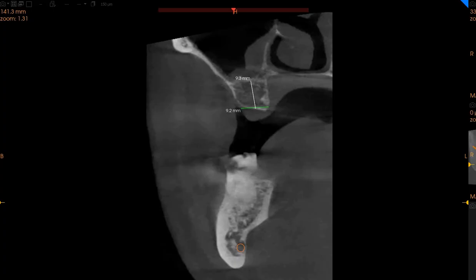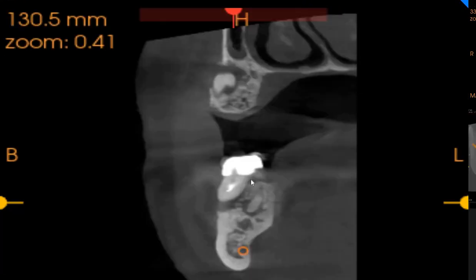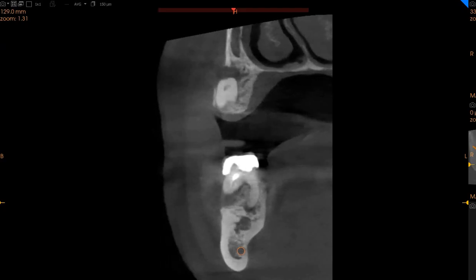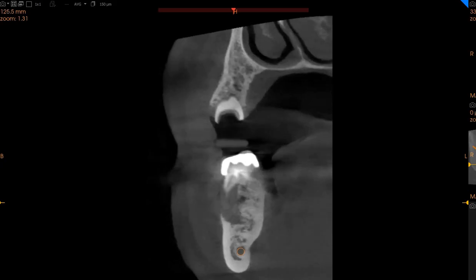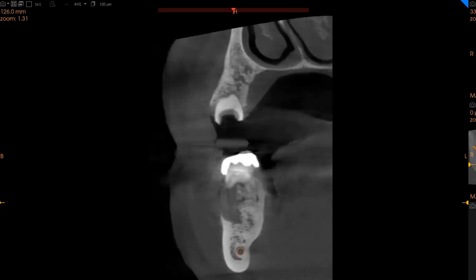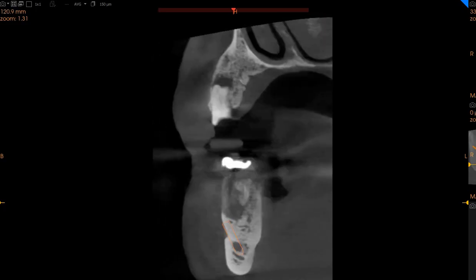Now, the doctors also asked us how the overall health is. The lower left 6 has a periapical radiolucency, which is quite significant. As you can see right here, we've got a radix entomolaris in this tooth as well, so all three roots are quite severely infected. We would advise clinical correlation, but this is a failing endodontic tooth with extreme periapical infection.